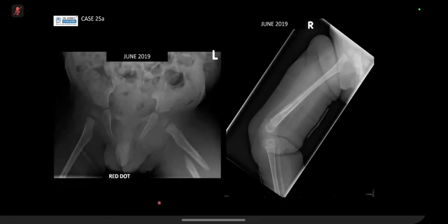Sorry, candidate 4. Are you looking at the left or the right? The right. The right hip. Are you looking at the right hip? Yes. Okay. And are you talking about some abnormalities in this region here? A little caudal to that, a little lower. Lower, here. I think subtrochanteric region, yes. Okay, so you think there's a malignant process going on here. What do you think of this?